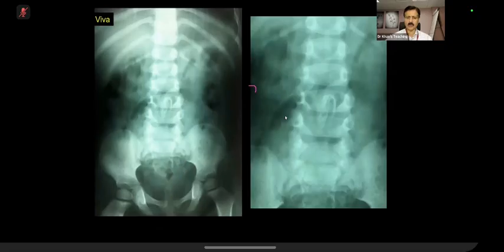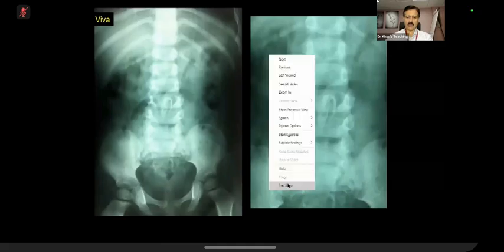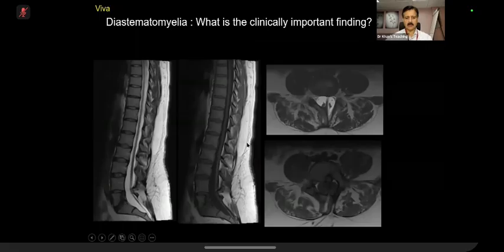So annotations are now disabled, and I have to clear one of them. Right. So, I've shown you how on a CT they can show. I have shown you how on a plain film they will show. But in an MR, they are going to show you on a sagittal, and then when you ask for the axial, it will make sense to you.